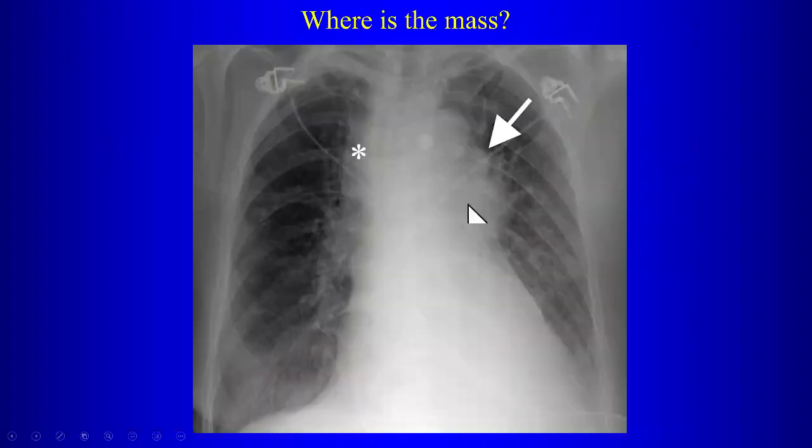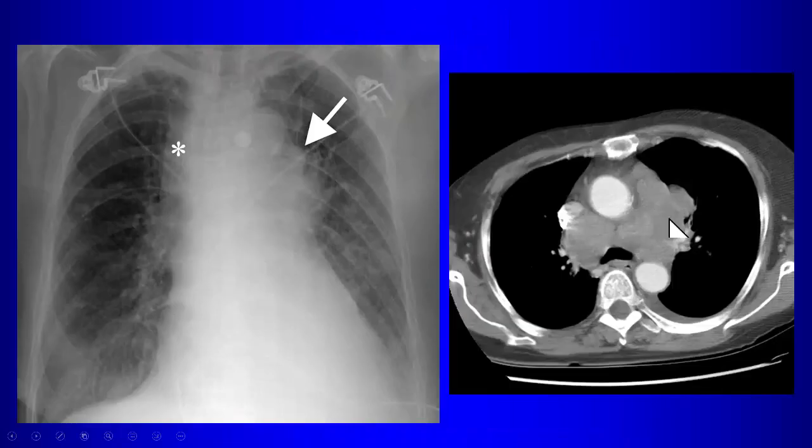Now in this case, again, we have a mass here in the AP window, but here we can't see the left pulmonary artery. So this is lymphadenopathy in the AP window, also extending to the hilum, obscuring the left pulmonary artery. So here you don't have a hilum overlay sign. Right? There's also right paratracheal lymphadenopathy. This is a patient with small cell lung cancer. So we have all this lymphadenopathy from the AP window extending to the left hilum that obscures the left pulmonary artery. Okay?